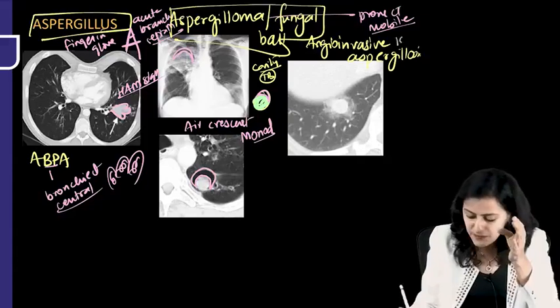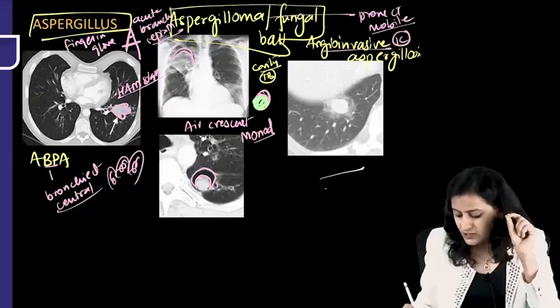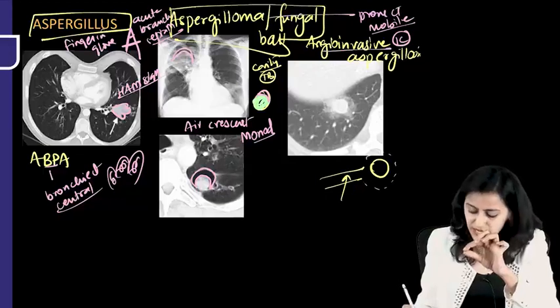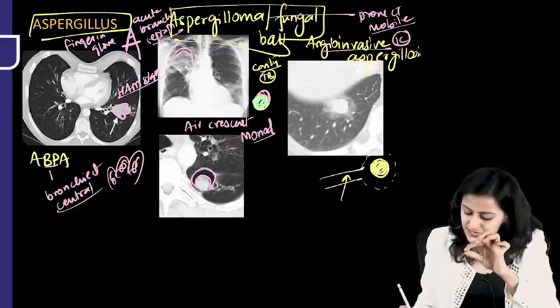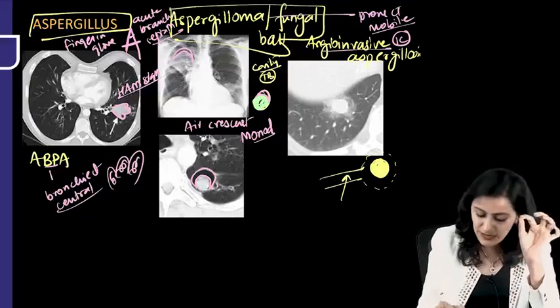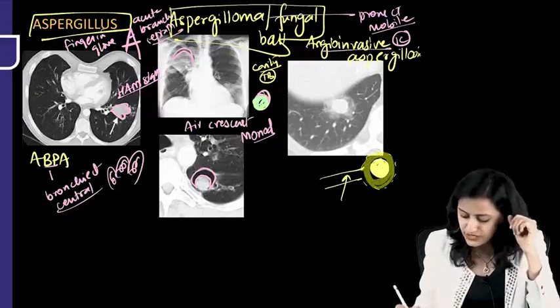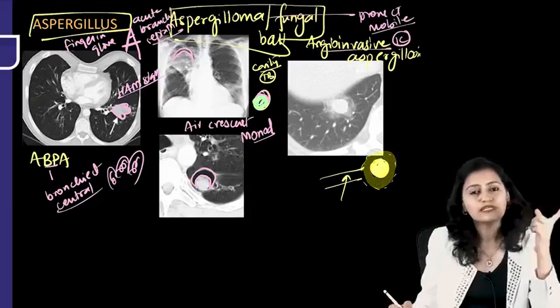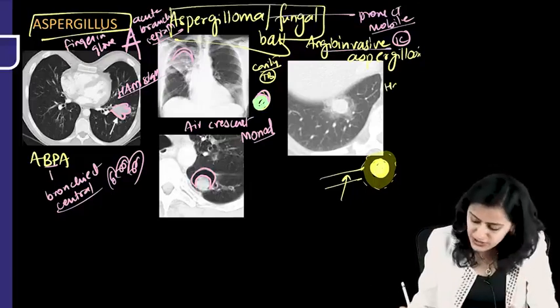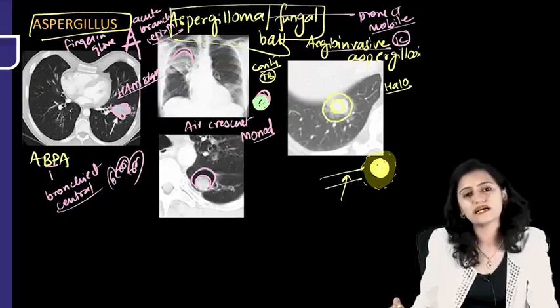Next, in immunocompromised patients, we get the most severe form of aspergillus infection, that is angioinvasive. So with the invasion of the vessel, the lung develops the infarct and the surrounding hemorrhage. So what we get is this infarct in the center that appears like a consolidation, and surrounding the infarct we have the halo, the hemorrhage that is forming the halo. So infarct surrounded by hemorrhage gives the halo sign. So angioinvasive is the halo sign where you have the infarct, consolidation and the ground glass opacity.